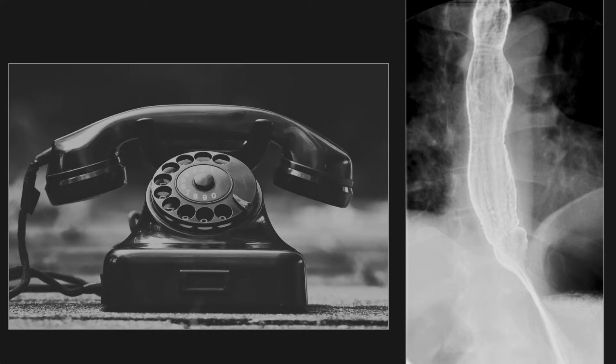These requests can be a bit painful to handle, especially after hours. It can feel like a mess with sick patients, limited ability to drink contrast, and difficulty with positioning. But this is an important triaging tool to look for the size of the leak, which helps direct cardiothoracic surgery to know if the patient can be managed conservatively or needs surgical repair.